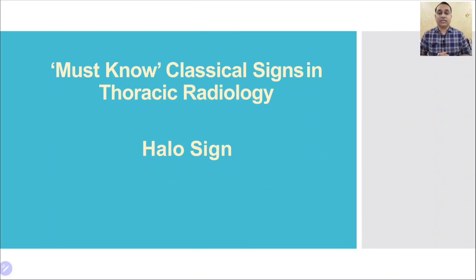In the short lecture series, Must Know Classical Signs in Thoracic Radiology, I am back with one more very interesting sign, which is called the halo sign. So in today's lecture, I am going to discuss what is halo sign, how it looks, how to identify halo sign radiologically on CT scan as well as chest X-ray, and what are the conditions in which halo sign is present. So let us start with today's lecture.